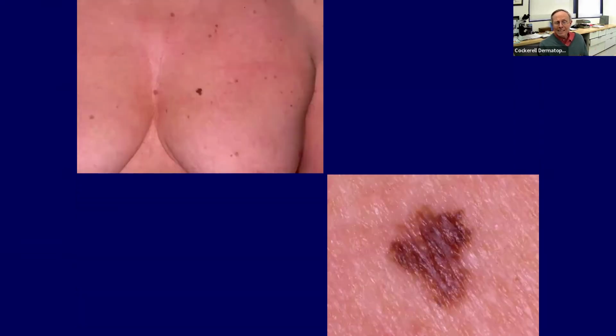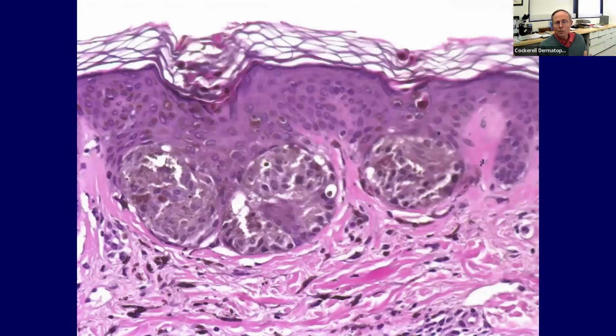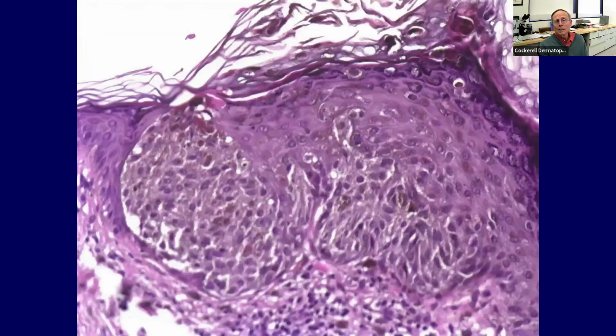Now, dysplastic nevi, especially on the breasts, commonly give unusual findings. They give you a little bit of pagetoid spread. They give relatively large nests, like you see in this example here. The melanocytes often have this relatively abundant fine dusty melanin in their cytoplasm. Again, this is within the range of normal in this location. So this is not a melanoma.